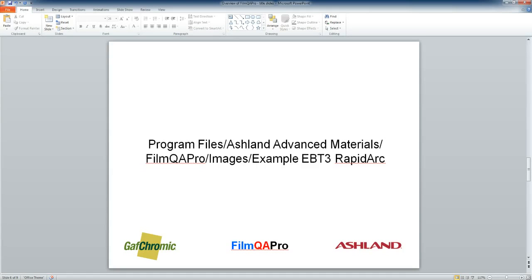Calibration films can be loaded from File, as in this example, or they could be scanned into the application. If you're acquiring calibration films via scanning, consult the tutorial module on scanning.